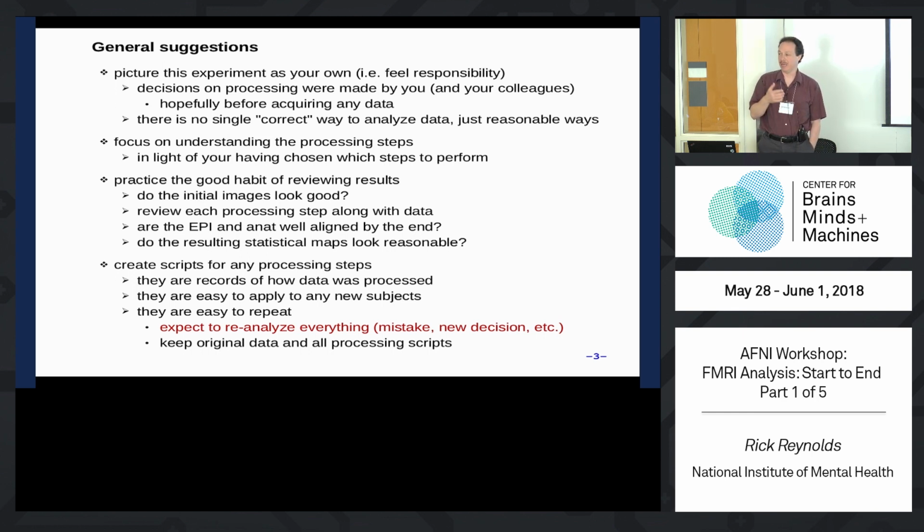You shouldn't be dropping an 8mm blur on this data. You're just wasting our high resolution. So let's change the blur to be 4mm, full width half max. So now you have to reanalyze all the data. You should expect things like that, and so the basic point there is you want to just be organized up front so it's easy to plug in a new subject.